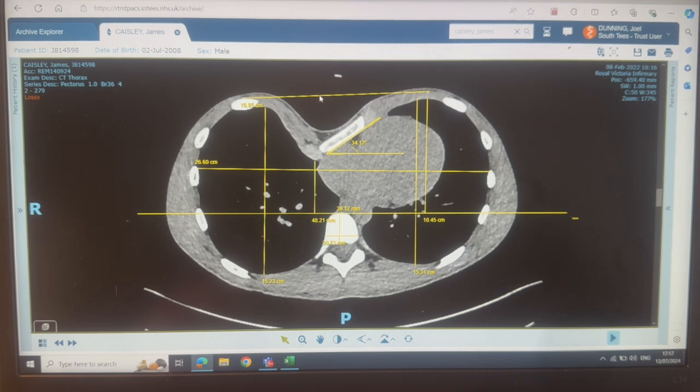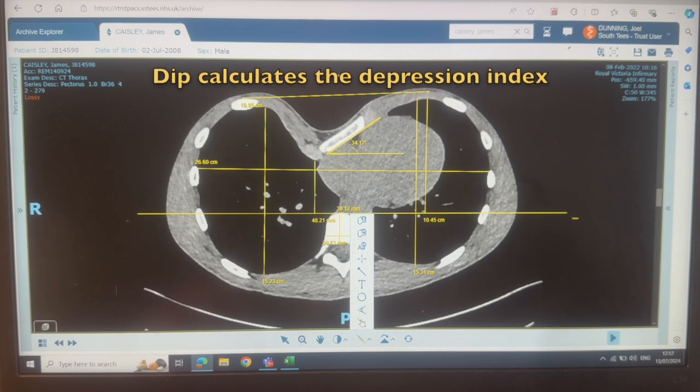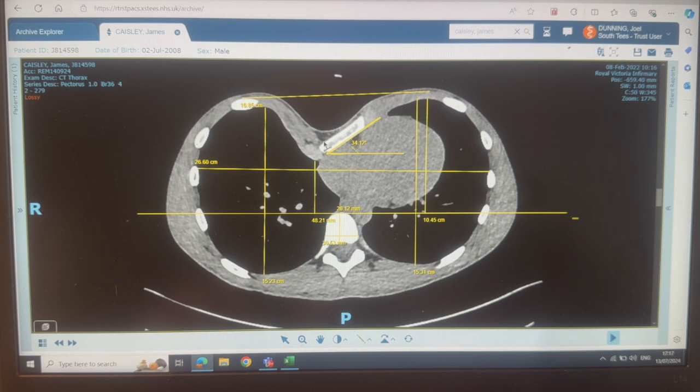Oops, one I've forgotten is the dip. We're actually measuring the dip. The dip is from this line, from both the two heights, down to the anterior table at the deepest point, so in a vertical line. So we take it from the anterior border of the sternum. So it's not the skin and the subcutaneous tissue, it's either cartilage or bone for the dip. So now we've got our full set of measurements for step 1.